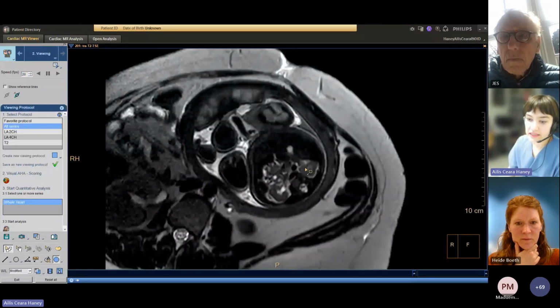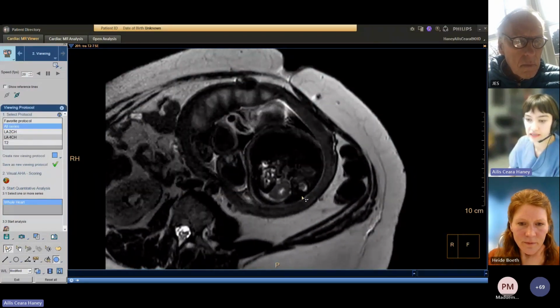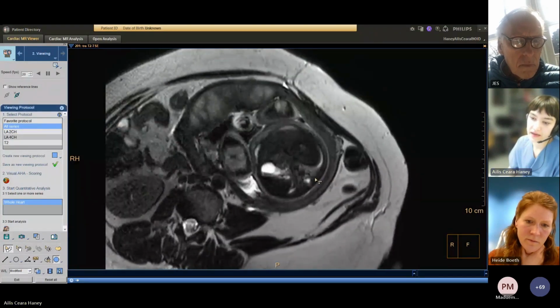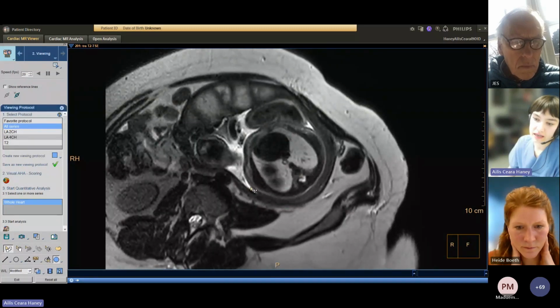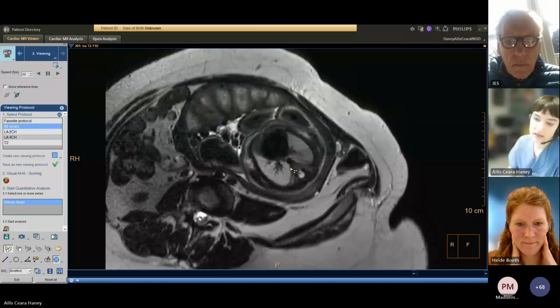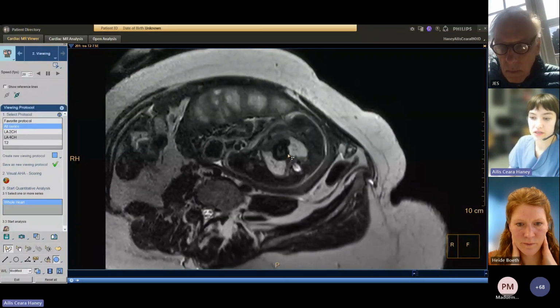So we'll just look at this sequence. As I said, we felt this was the sequence that really answered our question. So obviously we're interested in the aorta, the anatomy of the aorta in this case, and we'll just follow the descending thoracic aorta here, continue heart left to right, continue upwards, and we have the aorta here, keeping it here, and then we have this image which basically answered the question for us.